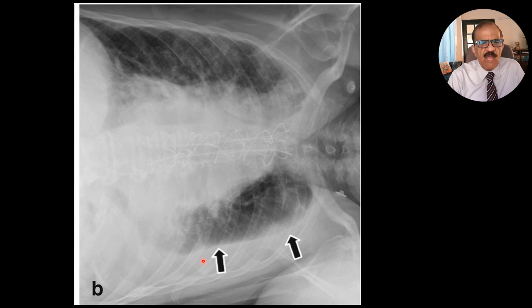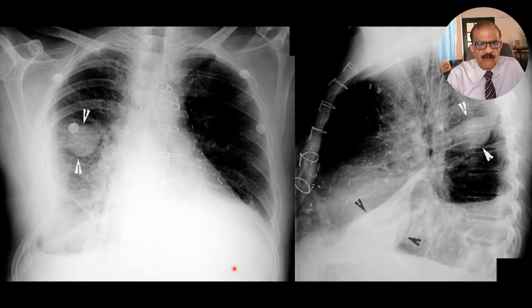So if you have doubt about the diagnosis of encysted effusion, you can take this lateral decubitus view.